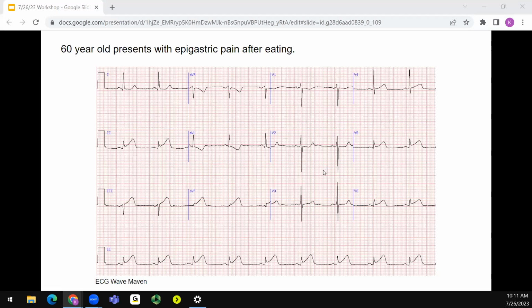When you see hyperacute T waves in 3 and a T wave inversion in AVL, that doesn't necessarily meet STEMI criteria just yet. It's more ammo to say that if I continue to get EKGs, they're going to become ST elevations later, so you can act on it soon. Whenever you see an abnormality like AVL inversion, you should instinctively look at the inferior leads, and vice versa.